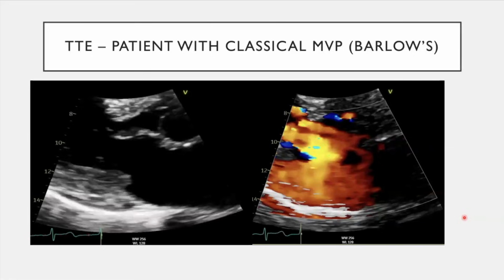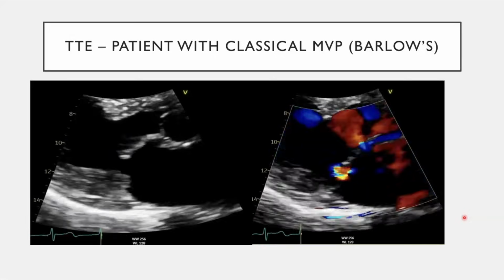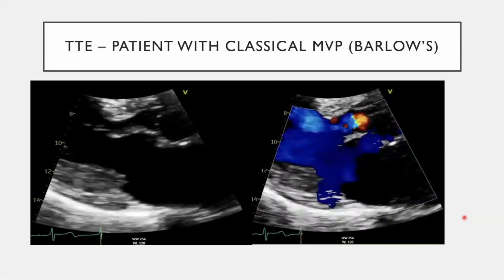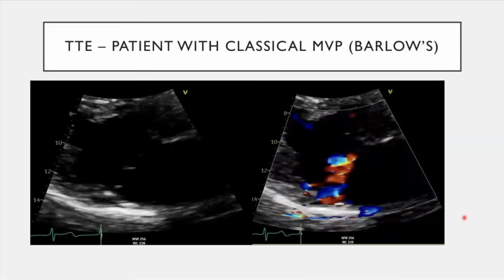So I just want to share some cases of mitral valve prolapse that I've been a part of during my past 2 weeks on elective here at St. Mike's. All of these cases that we're looking at are from St. Mike's. This is a patient in his 80s with mitral valve prolapse.